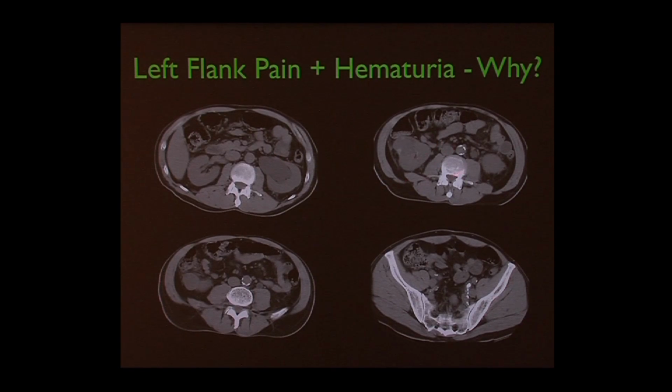And then if we go down, we can see the fluid in the ureter, the tube that drains from the kidney to the bladder. Here we see the ureter. It's big. This is the tiny little normal size one on the other side. And then as we go down into the pelvis, you can see this very bright white structure, and some other white structures too. We have to know the anatomy. The other white structures are atherosclerotic plaque in this patient's vessels. So this patient has atherosclerosis, and they're calcified plaques. But that is a ureteral stone, a kidney stone that passed down and obstructed the ureter.